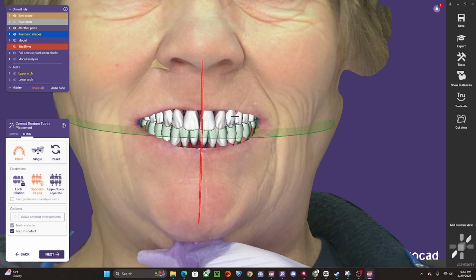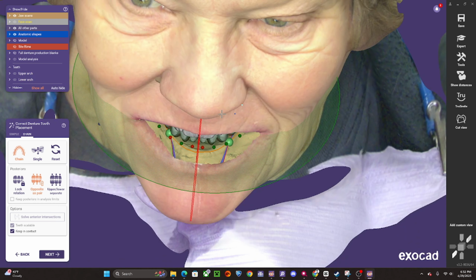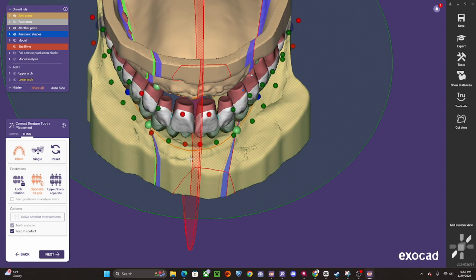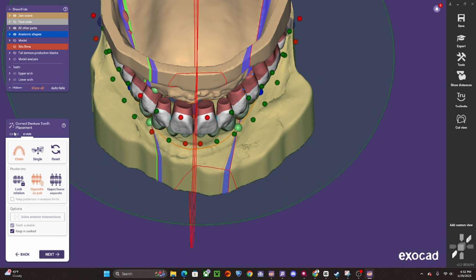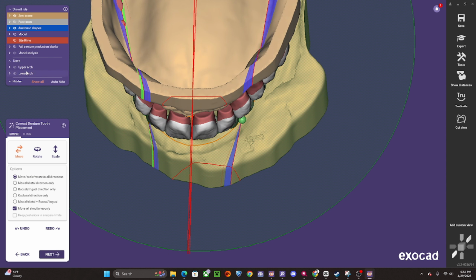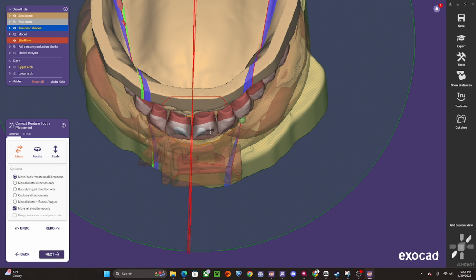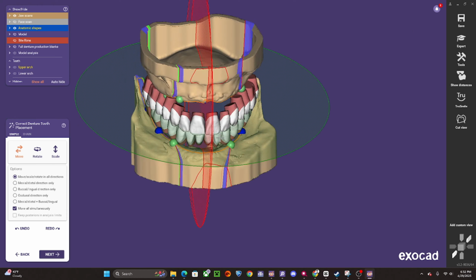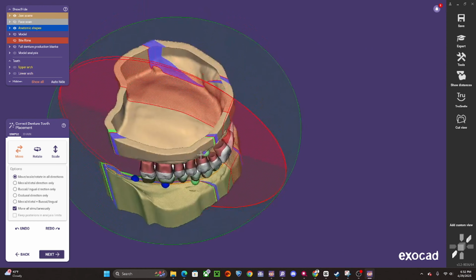So by moving that out, I've scooched that out a little bit. And then I'm looking at our setup here, and I do think that I should pull this more facially. So I'm going to go back to simple and bump our tooth mold out a little bit facially. Just like so. I want to reach this bite rim position, at least for this lower as well.